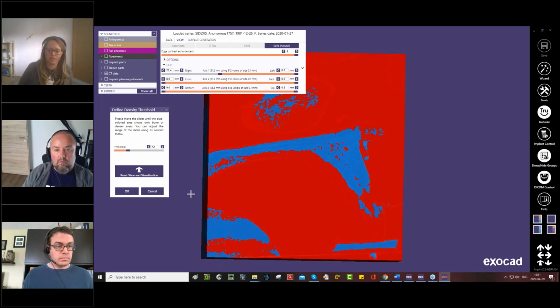You can see that if it's sticking out somewhere, oh, it's red there. Let's check it out. Okay, I have some bone anyway. It's not as dense, but it's okay. Or maybe like in this case here, there was no bone where I wanted to place it when I placed it more occlusal. So then the implant was red.